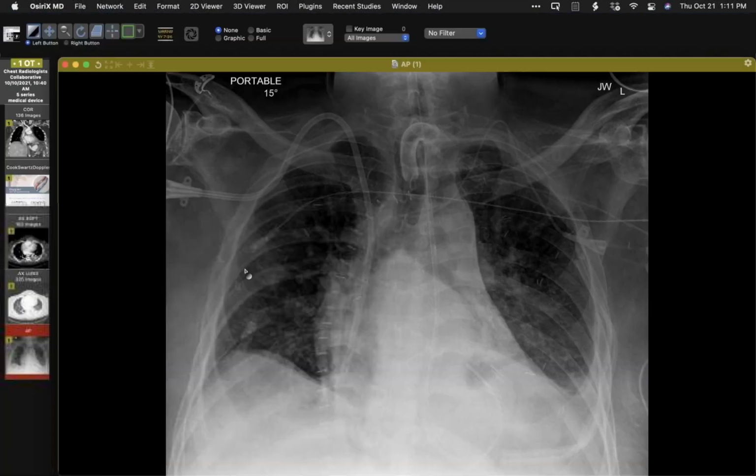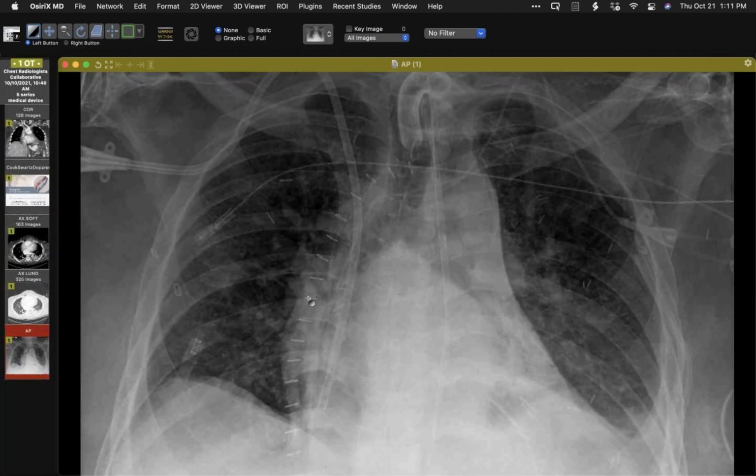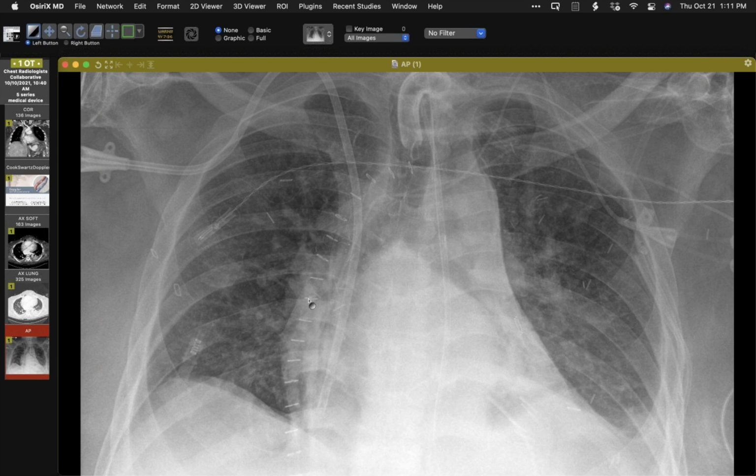Okay, this one is just for your interest. So this patient has a rather complicated history. The most relevant recent history is that he had a surgical procedure to close an open sternal wound. So we do not have sternal wires. And I think he's had a total of 2 surgical plastic procedures, the most recent of which used tissue here in part to fill in the sternal incision.